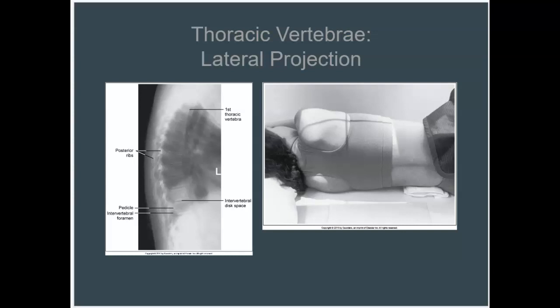The number of vertebra visualized depends on the size and shape of your patient, of course. So T1 to T3 may or may not be adequately visualized. And as you've seen previously, the image analysis guidelines are available to you on the PowerPoint.